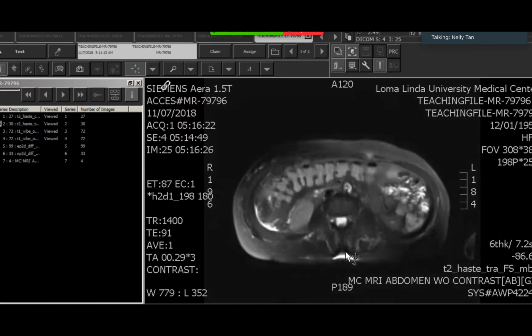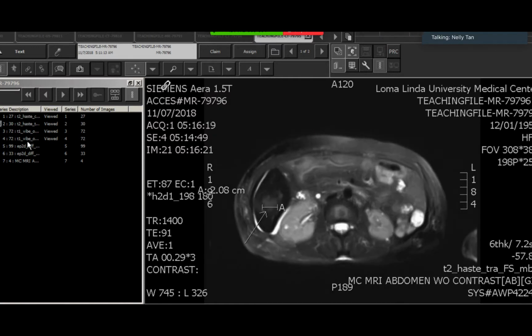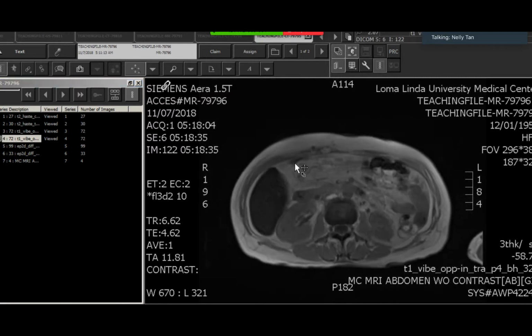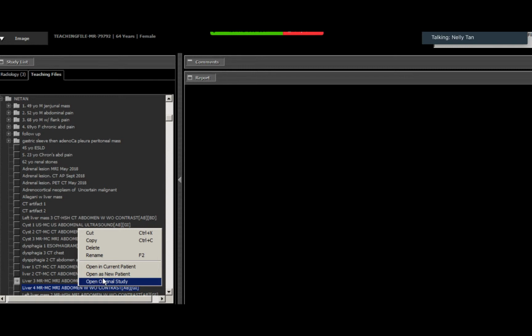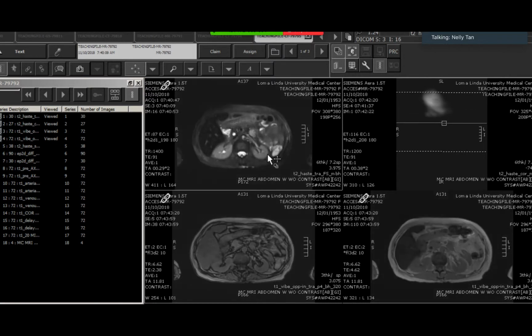So they called this a liver mass. They gave a differential diagnosis. It was done without non-contrast, but I can show you the pre and a post phase. There's no fat in it. It's new compared to that. Initially, and then when I was on service, I saw they recommended an EOVIST MRI. So they got an EOVIST MRI, which is what I read.